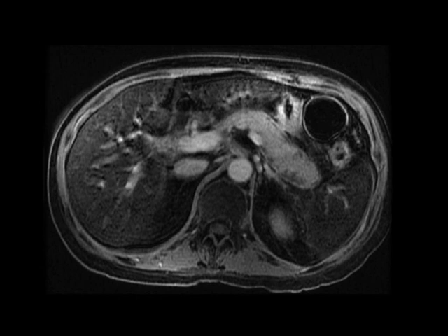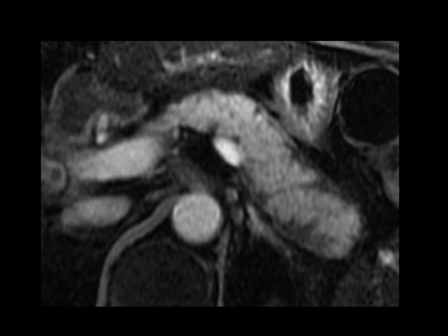So here's a beautiful example on MRI. You can see that the entirety of the pancreas appears enlarged. It has this characteristic sausage-shaped morphology, and there's this low signal intensity rind around the margins of the pancreas, which gradually demonstrates increasing enhancement on the venous and delayed images. This is a characteristic example of autoimmune pancreatitis. This patient had an elevated IgG4 level, and this patient did very well after a round of therapeutic steroids.